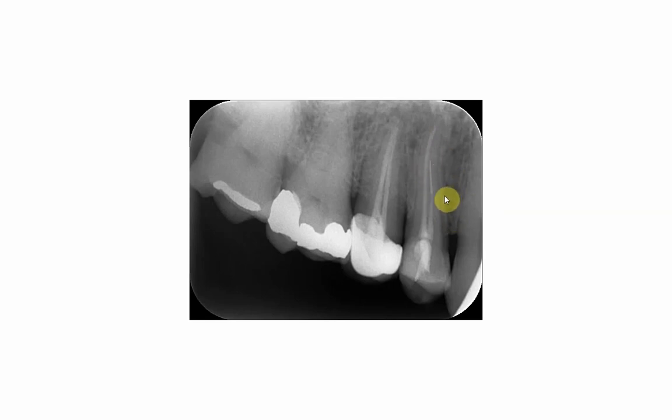or endodontic instrument that has been broken, and apparently there was an attempt to take it out, but it was difficult, so it was left in place. If you compare the radio opacity of the material and the shape, then we will assume that this is a broken endodontic file or a reamer that has been left in place and has not been recovered, or has not been taken out.